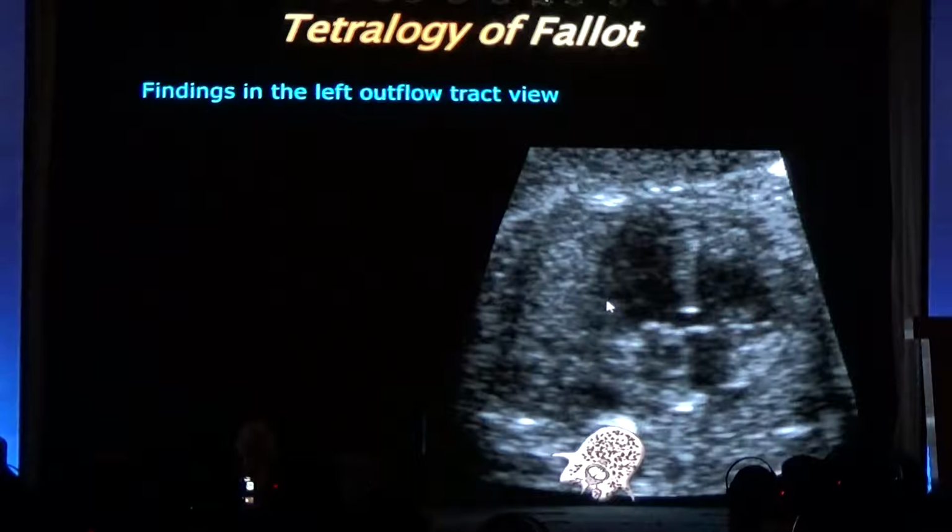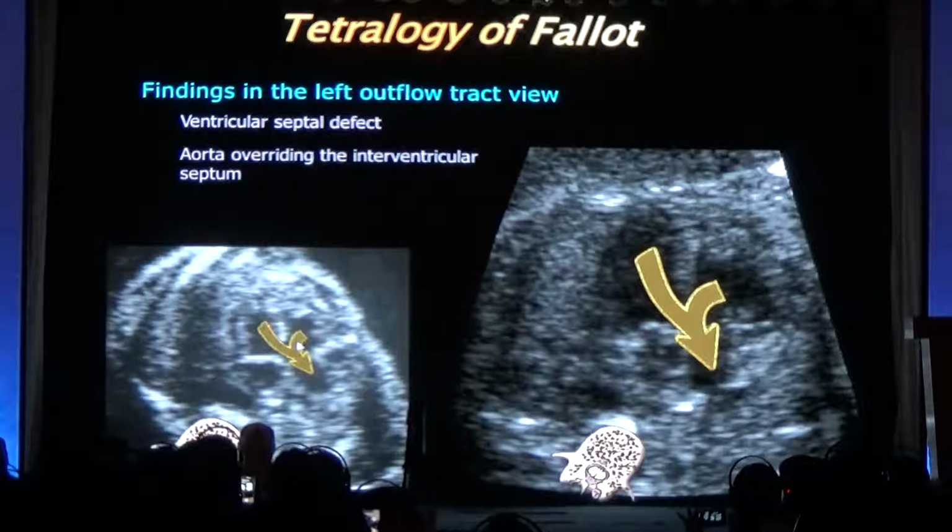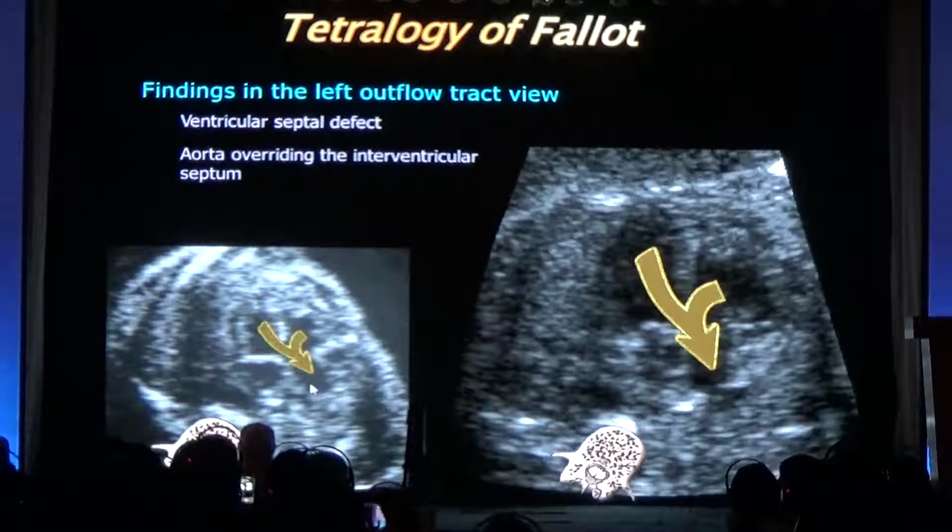It's called double outlet right ventricle. So be aware of that, so that when you diagnose tetralogy of Fallot, think to see what the overriding is, because it could actually be double outlet right ventricle. But these are technical details. Fundamentally, you have made the correct diagnosis, and you see both ventricles emptying in the aorta at this level.